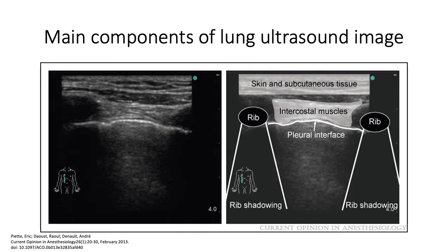Let's look at the main components of a lung ultrasound image. Ultrasound waves are completely reflected by air. So in air-filled lung parenchyma on ultrasound, the image appears dark, as seen here on the picture on the left. In lung ultrasound, we look at surrounding structures that are detected by ultrasound waves, such as the rib, which, since it's bone, will show up as bright, the pleura, and structures like the liver and diaphragm. We also evaluate lung ultrasound looking at artifacts that are generated by ultrasound.